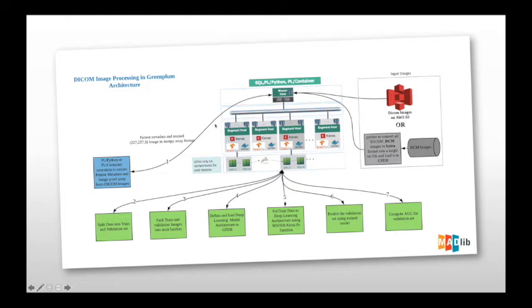Then you can use PL/Python or PL/Container functionality to extract the patient's metadata and image pixel array data from the DCM images. So we have loaded the DICOM images as-is in byte array format. Now we have to extract the patient's metadata and image data. The image data is buried inside those DCM images.